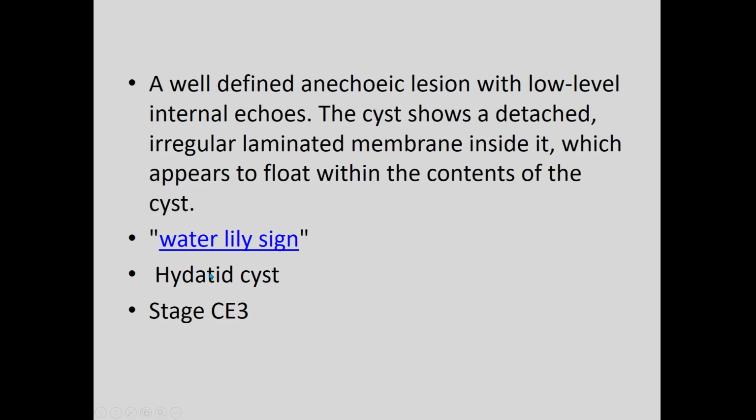And what is your diagnosis? Hydatid cyst. And what is the stage? So you have just written the stage. Just like this, we are asking you in your exam, so you can write down like this. Okay, this is just an example.